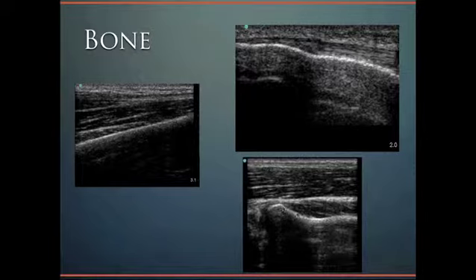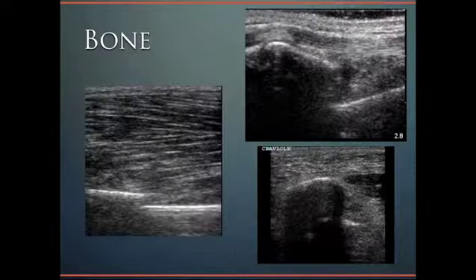This, in all these projections on this screen here, this is the long axis of the bone. When the bone has a fracture in it, we can see a step-off. So here's one bony fragment here, a step-off, and then another bony fragment here. We can see this up here as well. Here's a bony fragment coming along, step-off, and then another bony fragment going this way.